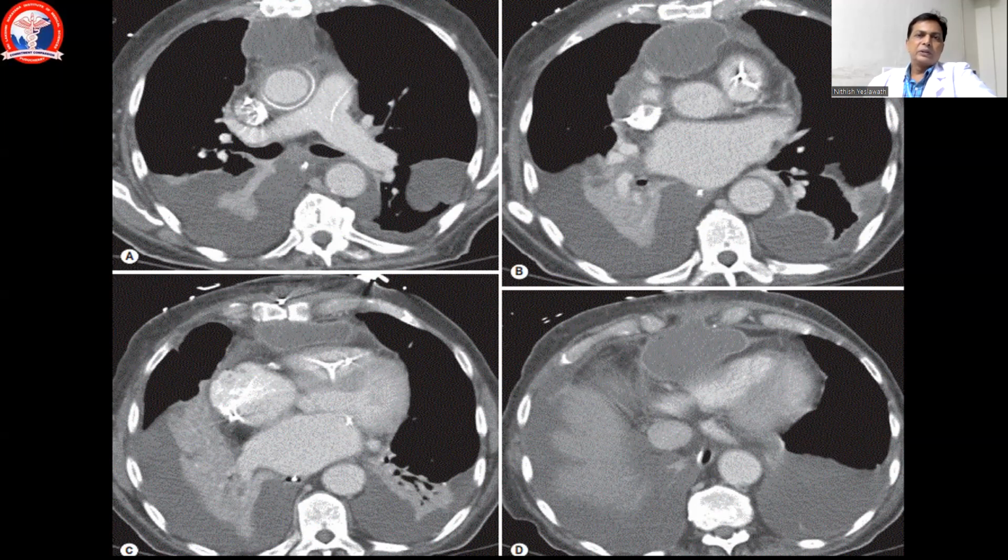What we get to see here is a hypodense area in the anterior mediastinum. This is the case actually. You can easily see here the sternotomy sutures. This is a post-op case. What we are seeing here is a soft tissue, fluid density area with an enhancing wall, a regular thick enhancing wall. Retrosternally, there is a fluid collection with an enhancing wall. It indicates abscess formation, post-op abscess formation probably. So this is a large mediastinal abscess.